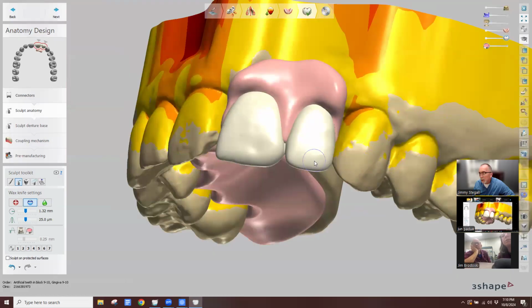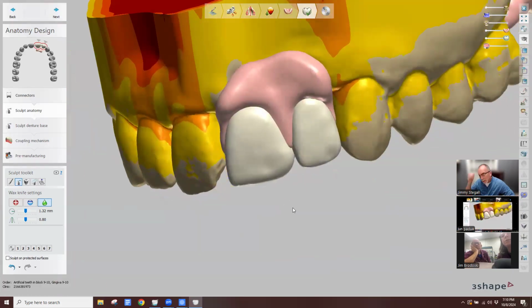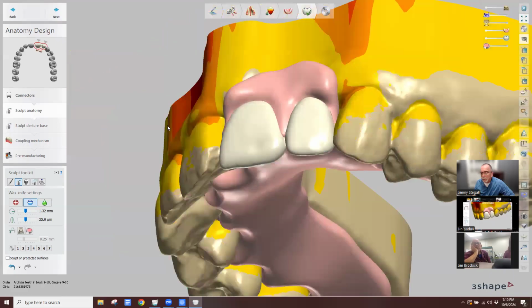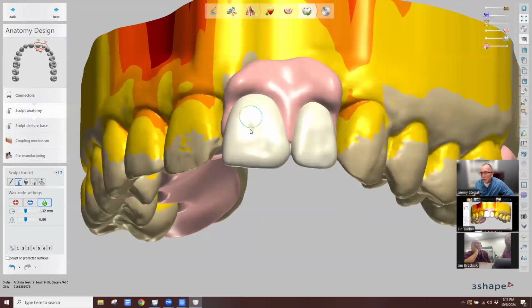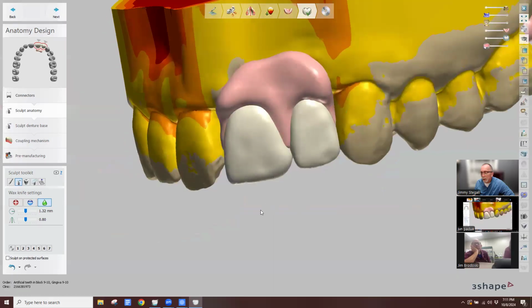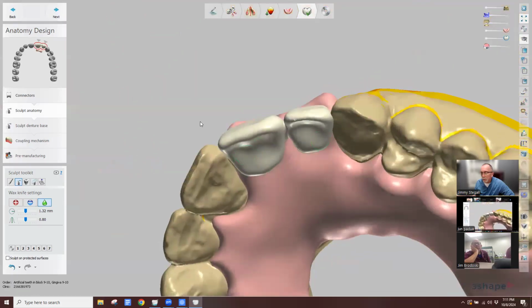Do I want to put a big notch in this lateral too? I also know that a printed tooth or a milled tooth, if I see the mamelons or a little bit of surface texture, it reflects the light better. I don't want to do a lot here, but I'm obviously thinking about everything around it. It was a bad setup job.